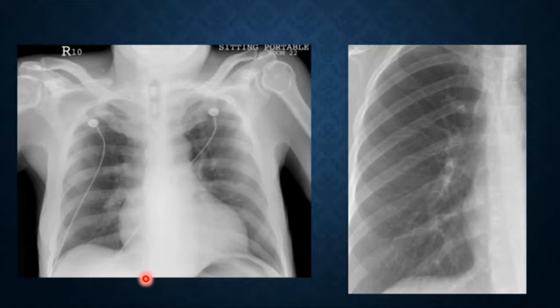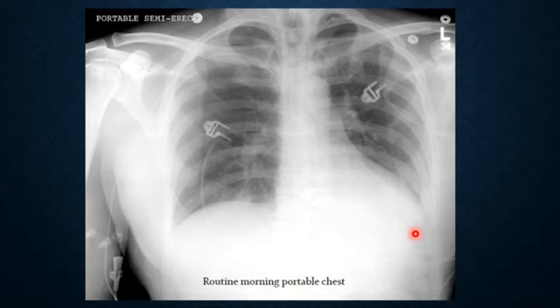On a chest X-ray, you will see what? There is paucity of the vessels. You can see the knuckles. You can see the hilar vessels prominent like a knuckle. We will see more examples here and there. Don't worry. This is a portable semi-erect chest X-ray. You can see this big prominent hilar vessel. The pulmonary artery is big, congested, engorged.